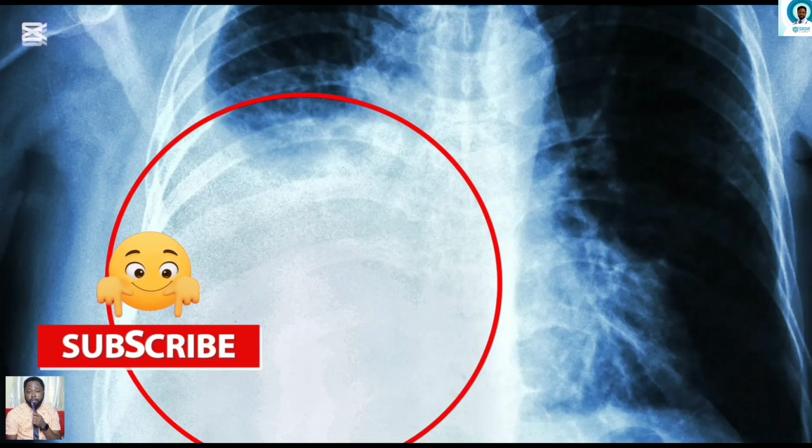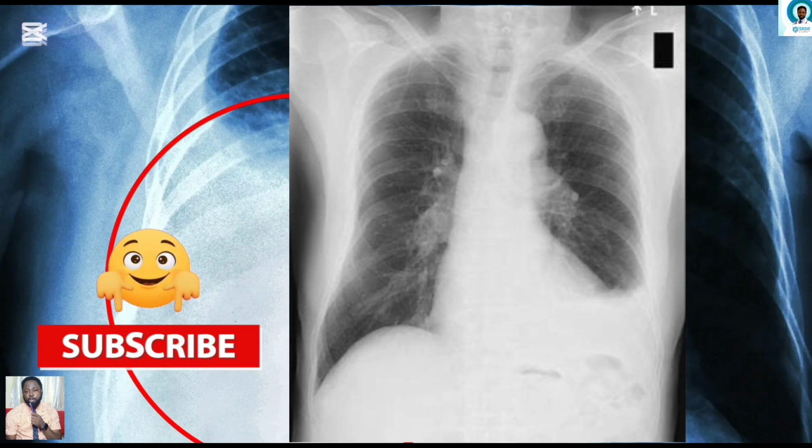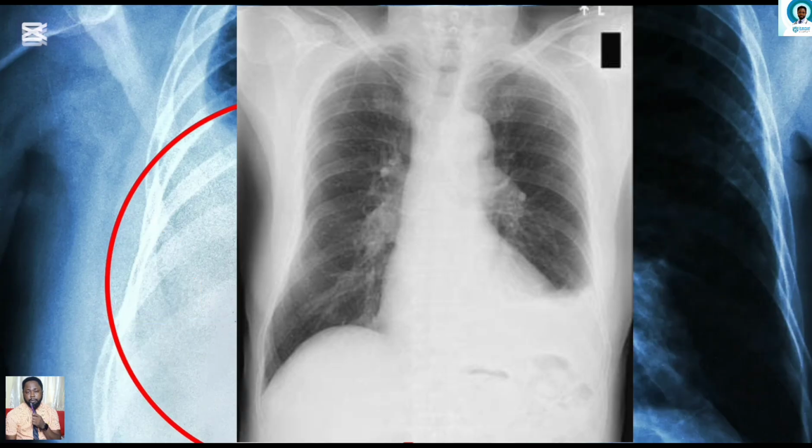The next image shows an X-ray with features of left-sided pleural effusion, and these features include blunting of the left costophrenic angle, homogeneous opacification in the left hemithorax, meniscus sign, as well as the blurring of the borders of the left side of the heart and the left hemidiaphragm. The radiological diagnosis is left-sided pleural effusion.